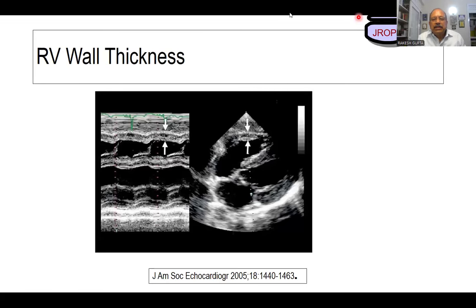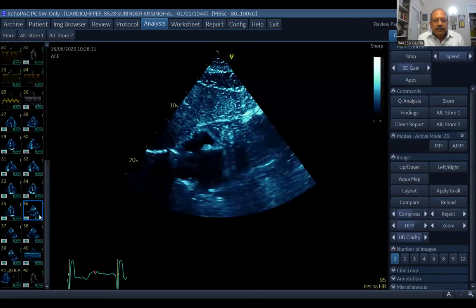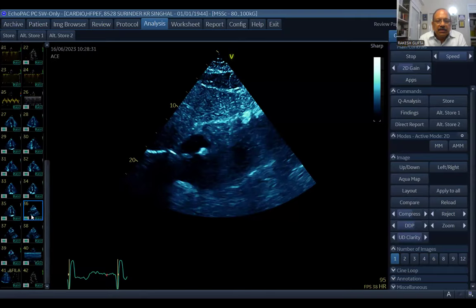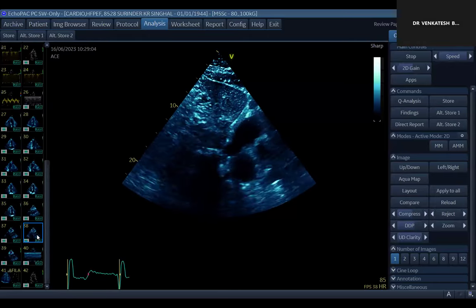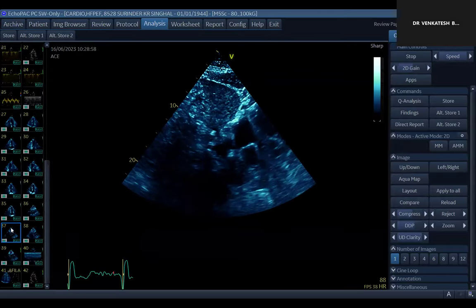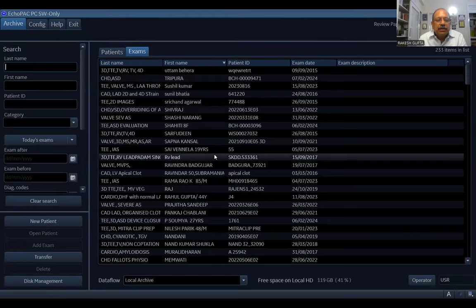So let me stop sharing this slide and go to a live demonstration. I think that'll be better for you. All right. Not happy with this. Let me see first. Go to RQ. Let me take out some COPD patient.